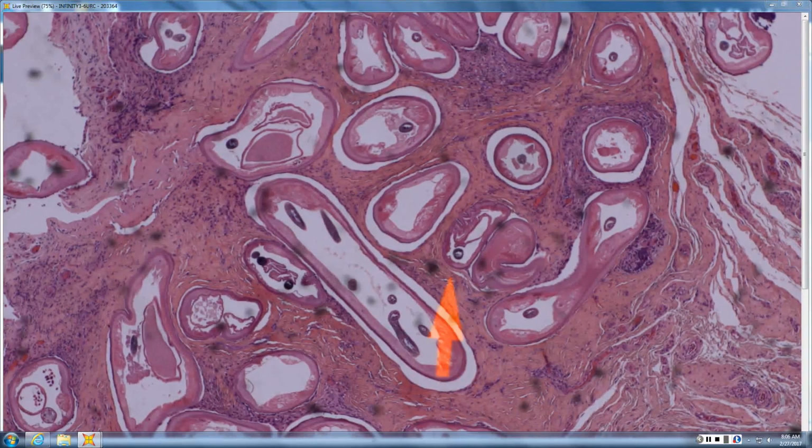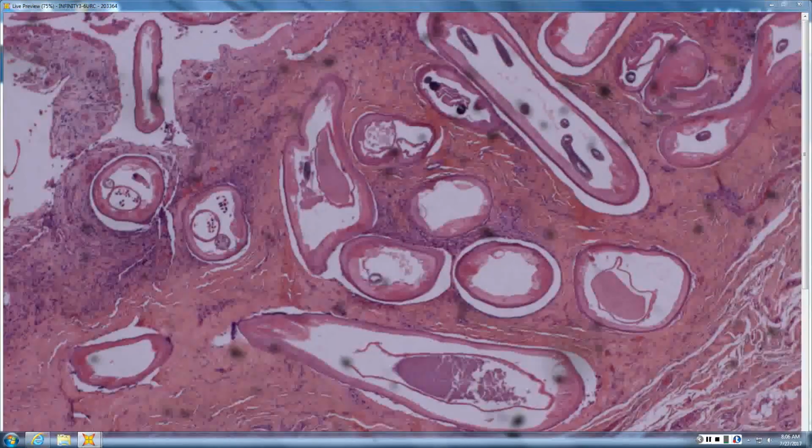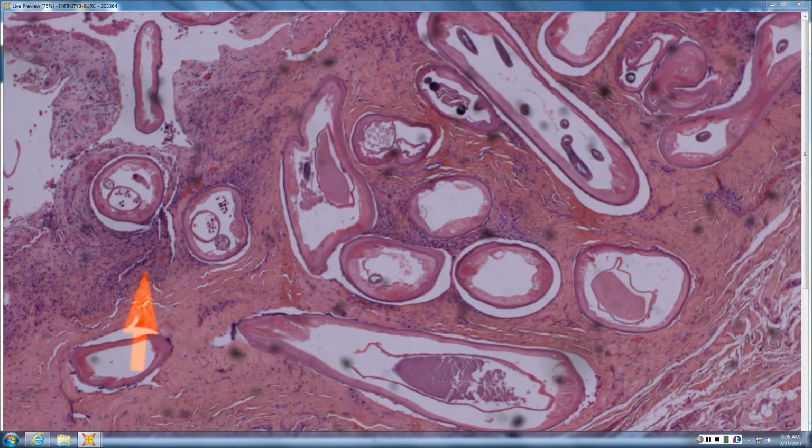Okay. This is like an onchocercoma. So how do you know that it's an onchocercoma? Well, it's a convoluted ball of kind of paired worms, with a bifid uterus and maybe some microfilaria. So she's pregnant, and he's not. He's flabby and has no muscle. Yeah, he's got no muscle, she's pregnant, they're married, right? So that's onchocerciasis, as opposed to the studly worms that are Dirofilaria, that get nothing for their trouble, but they look good.